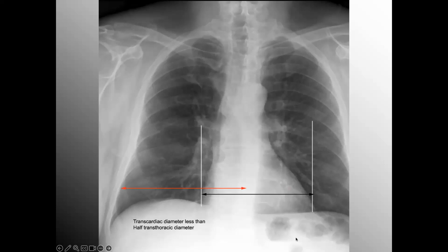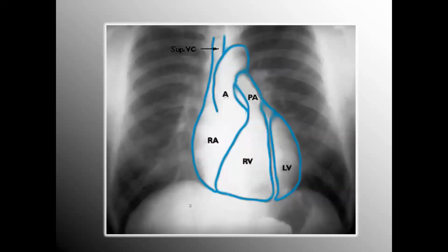From that point on, you get 10 radiologists in a room. I'll still say just 9 because there's always that one, right? But 9 out of 10 would agree. That would be cardiomegaly if your heart occupies one side of your hemithorax and begins to overlap the spine. Just a good rule of thumb. This is a good reference picture.